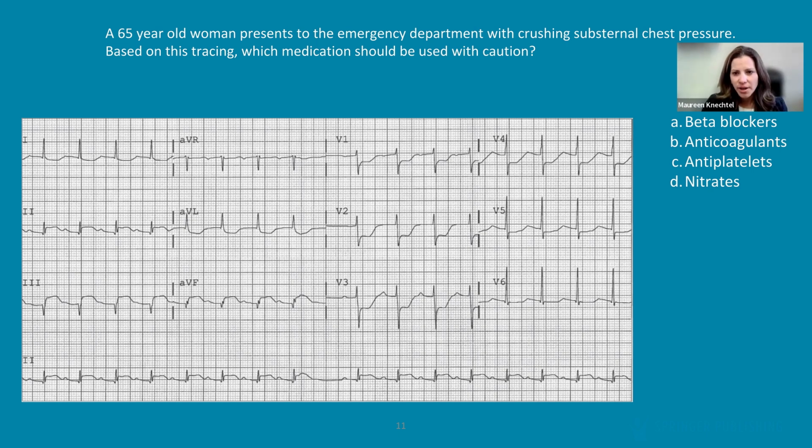If anyone has ever seen someone, usually in the ED, that's when you're seeing STEMIs, you get a paper EKG and they flip it over and look at the backside and hold it up to the light. You might think, what are they doing? Well, what you're actually looking for is you're trying to take the vantage point of the posterior wall of the heart, because none of the standard leads on a 12 lead tell us about the posterior wall. But that's a whole portion of the heart that we don't want to ignore. And so these leads are actually showing us reciprocal changes of the posterior wall.